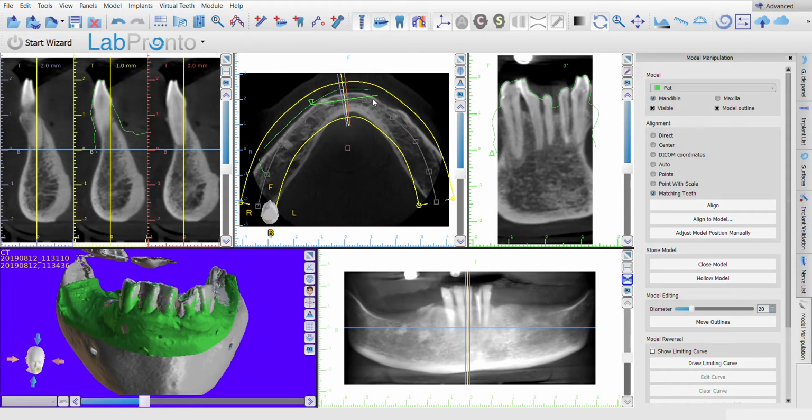Hi everyone, Dr. Omid Termechi here again, and we are continuing our series of short videos on how to work with a Blue Sky Planner and how to treatment plan your patients on their program, as well as being able to just generally diagnose and treatment plan your patients in your office, just reading a CBCT and converting it into some sort of planner.